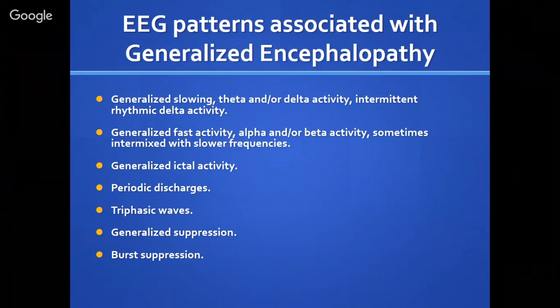Okay, and then we usually look at the EEG in the regular basic settings up to 70 hertz, the higher frequency, and the lower frequency is 1. So that's all the standards. And usually, even in the test, the question comes out, what are the settings that you use? So 1 hertz, 70 hertz.